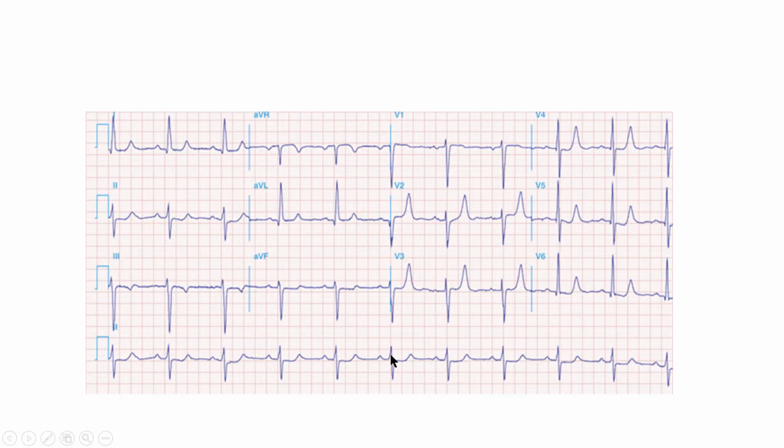Here we have a QRS complex that falls on the heavy hatch mark, so we're going to count our heart rate: 300, 150, 100, 75, 60. The rate is 60. We are now going to look for rhythm. We can see in lead 2 that there are obvious upright P waves, which are uniform in size, shape, and appearance, and then upside down P waves in aVR. We have sinus bradycardia at a rate of 60, or simply sinus rhythm.